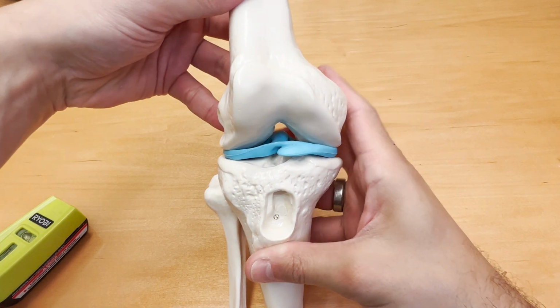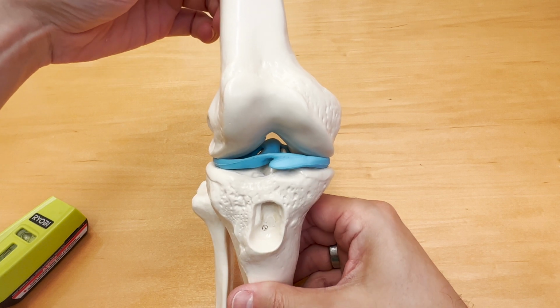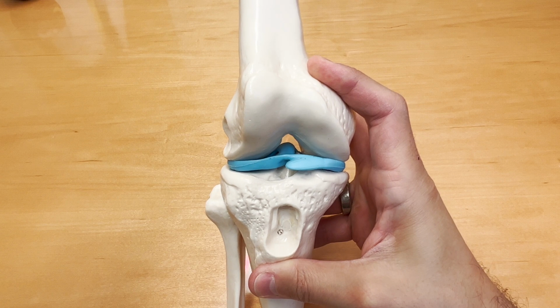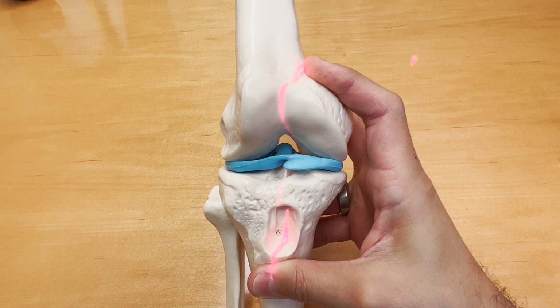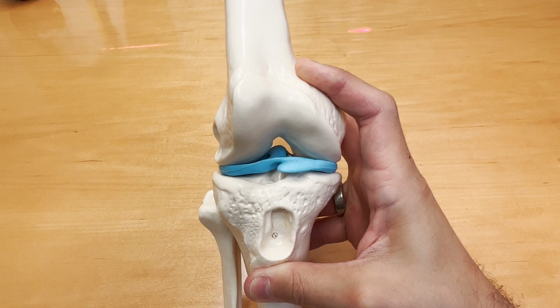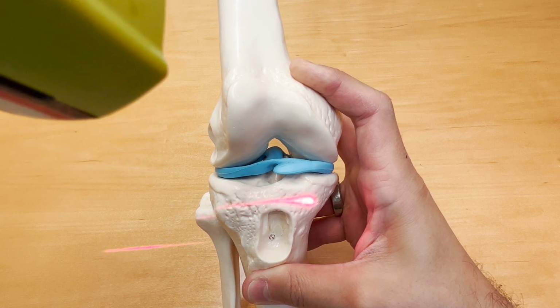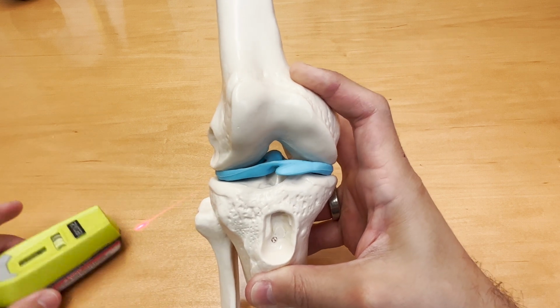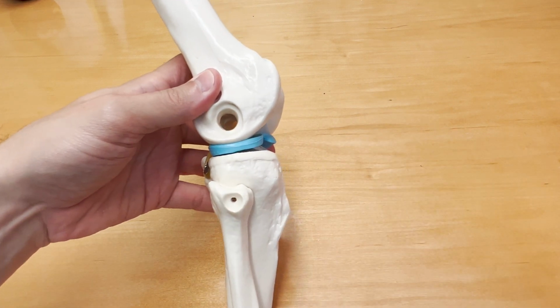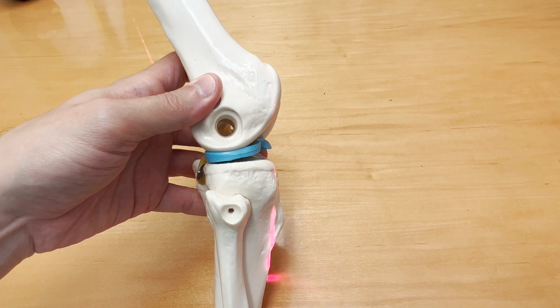All right, so we're going to now demonstrate with the laser what some of these cuts would look like on the knee itself. Here we are looking at the front of the knee, and we can make some cuts through the knee like this. So we can make cuts in this orientation across the knee, just like that. You see how that makes a kind of an up and down cut. We can actually make cuts up and down like this. So you see how that cut goes through the knee like so. And if we orient the knee more like this, we can make cuts through the knee like this. So there's my cut moving from front to back on the knee.